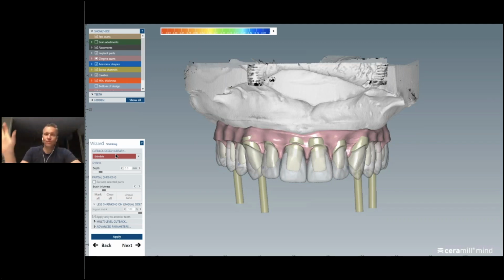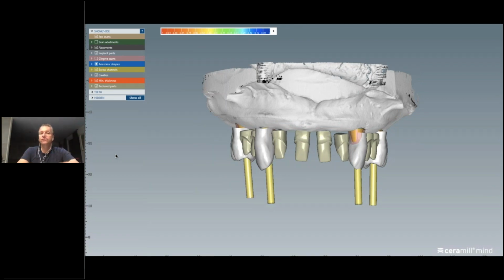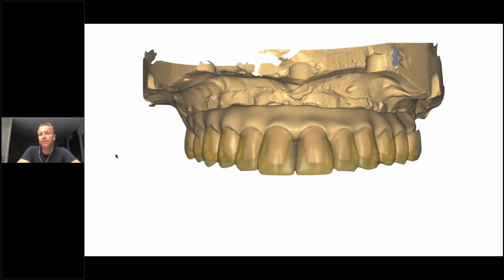They're also thrown in basically. So now I have to orient them better into my path of insertion, into my position of the thimbles. I would like to have them, especially also the margin, and I position them to the position I would like to. And then basically I can finish this up with these thimbles in place for then later on crowns, as shown before.